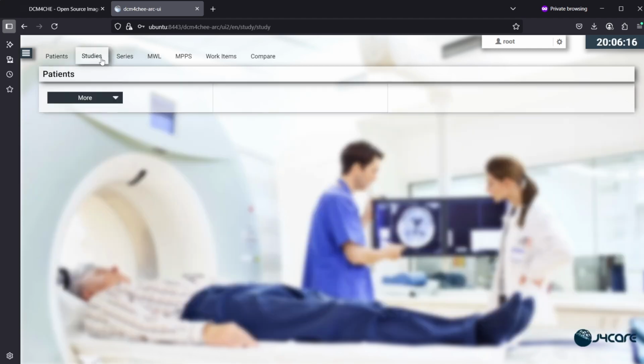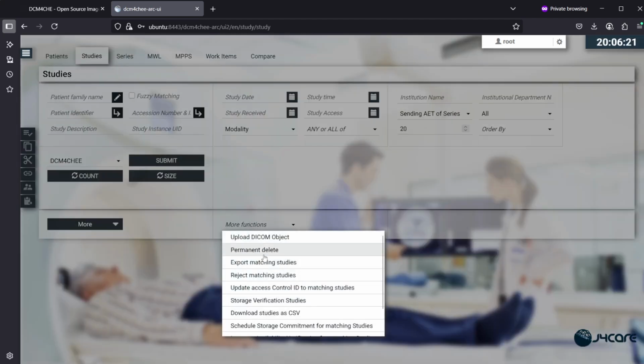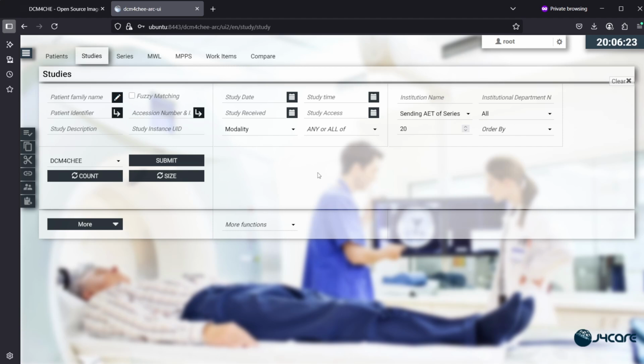delete functionality, which is available in the studies menu. There's another video about that which I recorded previously.